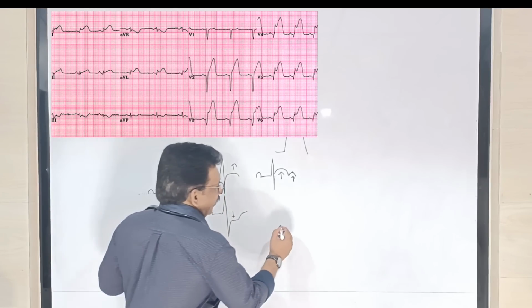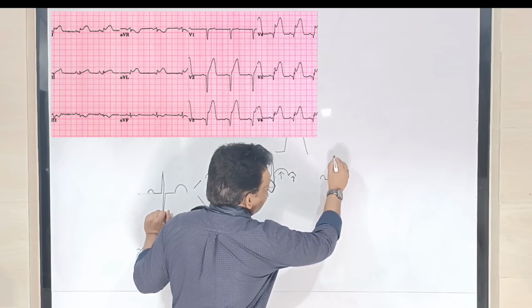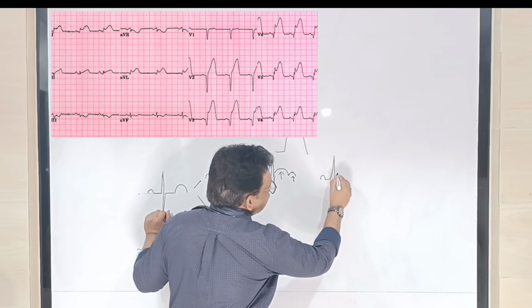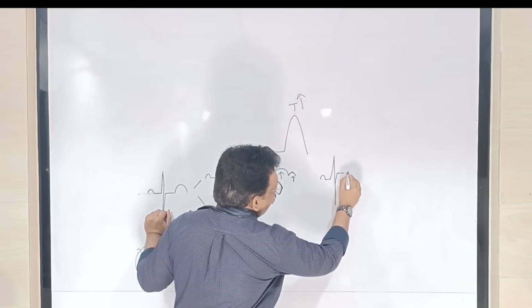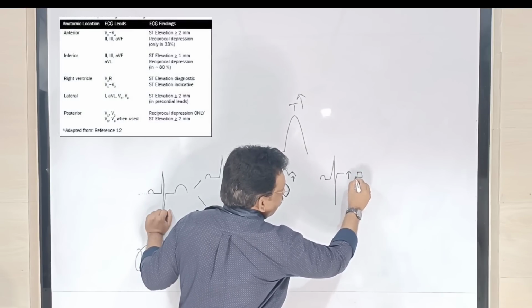Whatever it is, an ST elevation, ST segment elevation of more than 1 small square.